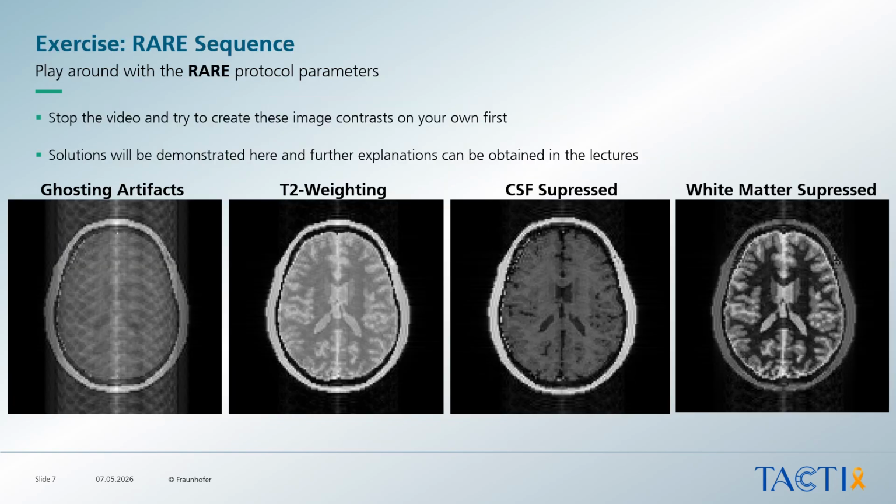Now it's your turn to play around with the RARE protocol parameters. Stop the video and try to create these image contrasts on your own first. The solutions will be demonstrated afterwards.